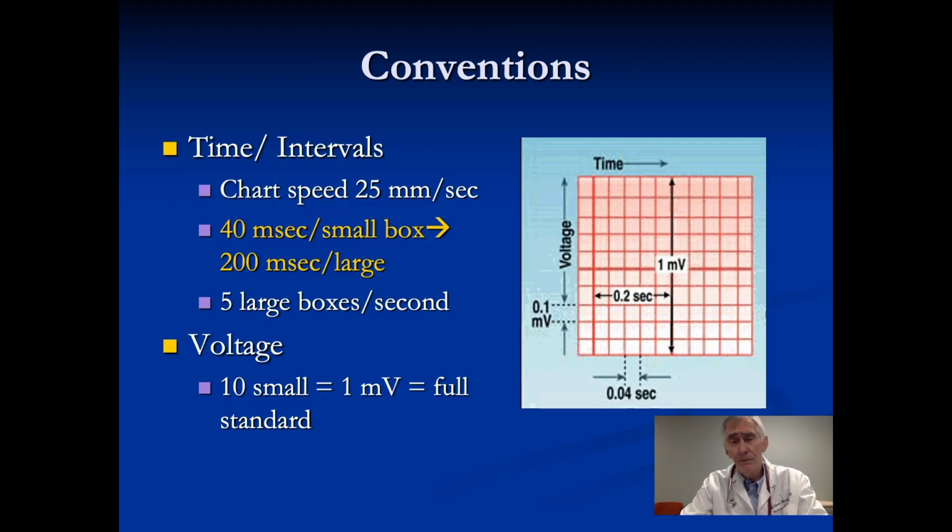Now there are certain conventions that you're going to see in terms of the electrocardiogram, at what voltage or what paper speed. These are seen to the left of the electrocardiogram, and when we start interpreting them, I'll point out that standardization. But 1 millivolt is represented by 10 millimeters of height on the y-axis.